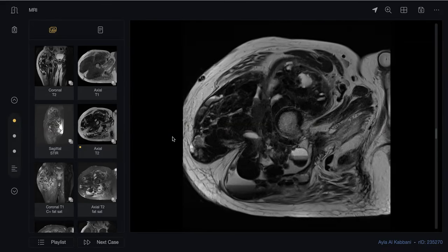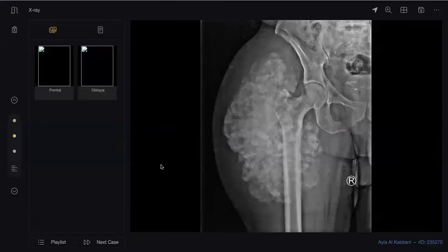You were saying maybe something? Tumoral calcinosis. I think this is tumoral calcinosis seen surrounding the joint, involving soft tissue and the muscle. Okay, good.